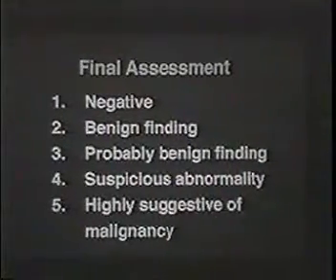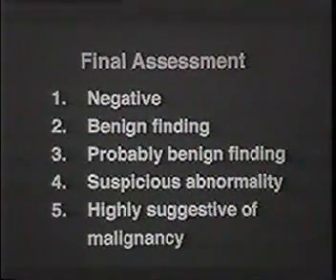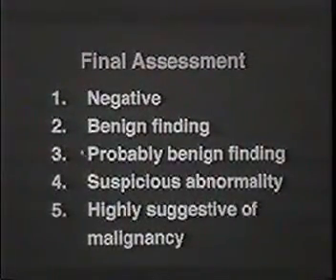Now, once we've looked at all the features of the calcifications, we have to make a judgment as to the likelihood of malignancy, and to do that, we again use the recommendations of the BI-RADS system, and we put it in one of these categories. Having used the mammograms to determine the likelihood of malignancy based on one of these categories, which would be either benign calcifications, or those that we're uncertain about but have a very high probability of being benign and low probability of malignancy, we would do a 6-month follow-up. So these categories help us determine what we're going to do with these calcifications in terms of our management.